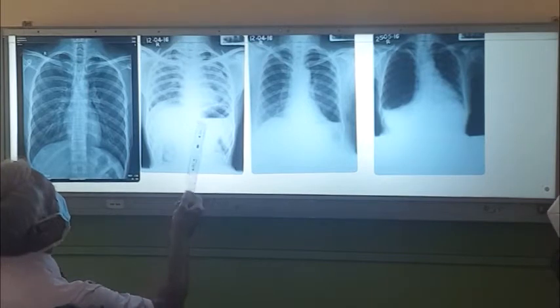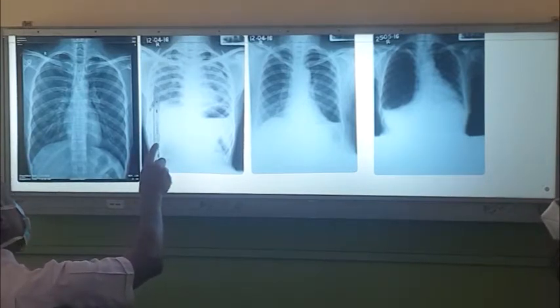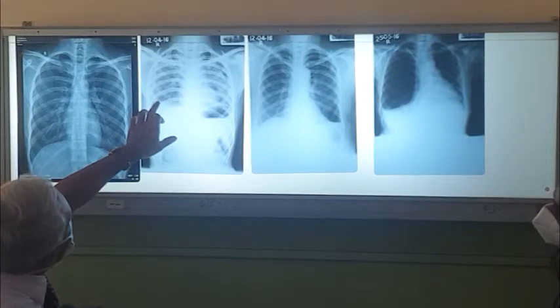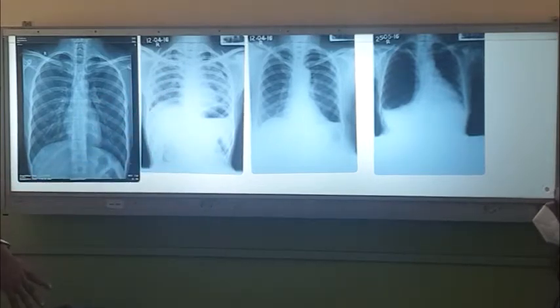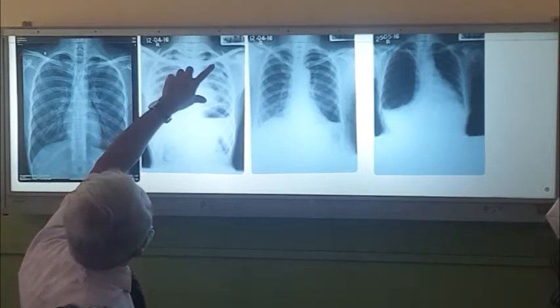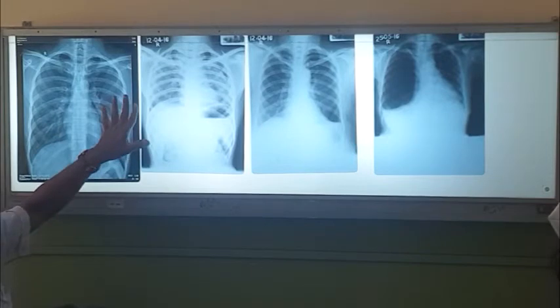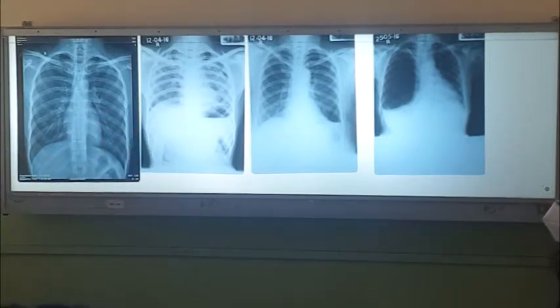Now this patient, everything looks whitish, intervertebral disc you can't see. 1, 2, 3, 4 is touching here, right? Looks expiratory. And the patient has bilateral reticular nodular opacity. So it's a patient with primarily fibrosis. And if you look at here, no lung tissues in this area, suggesting there is a small pneumothorax there. So this is a lung fibrosis patient presenting with pneumothorax, right?